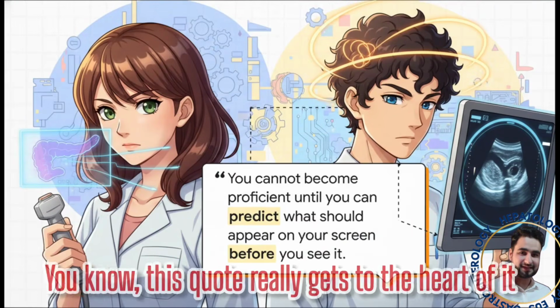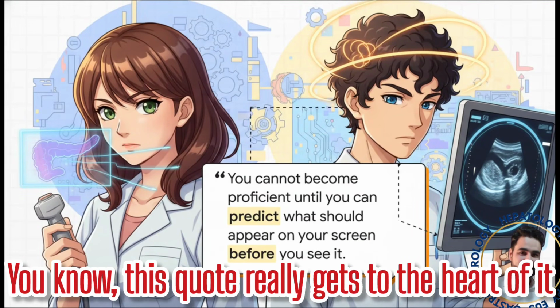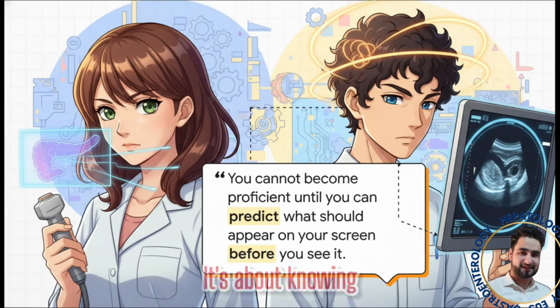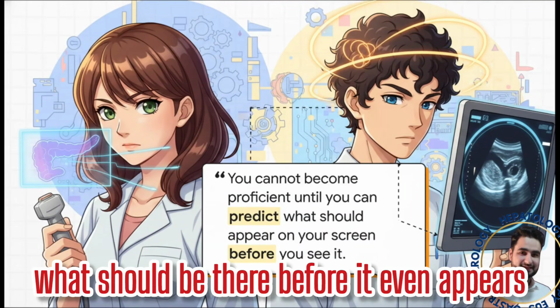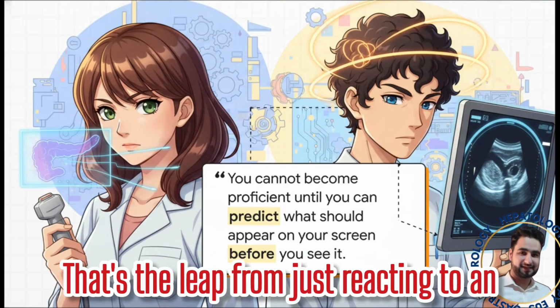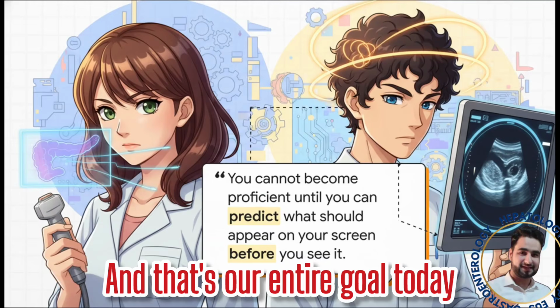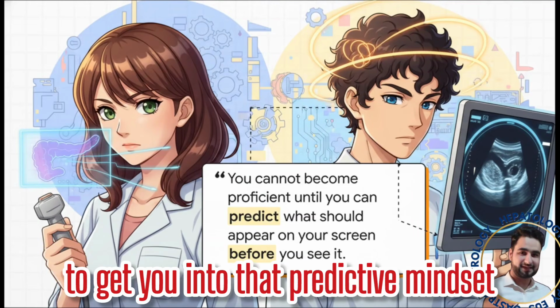You know, this quote really gets to the heart of it. Being good at EUS isn't just about seeing what's on the screen. It's about knowing what should be there before it even appears. That's the leap from just reacting to an image to truly predicting it. And that's our entire goal today, to get you into that predictive mindset.